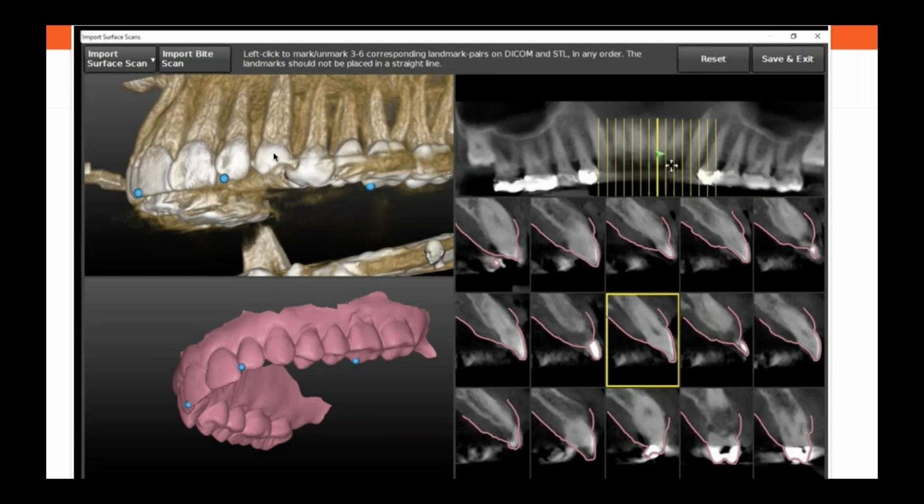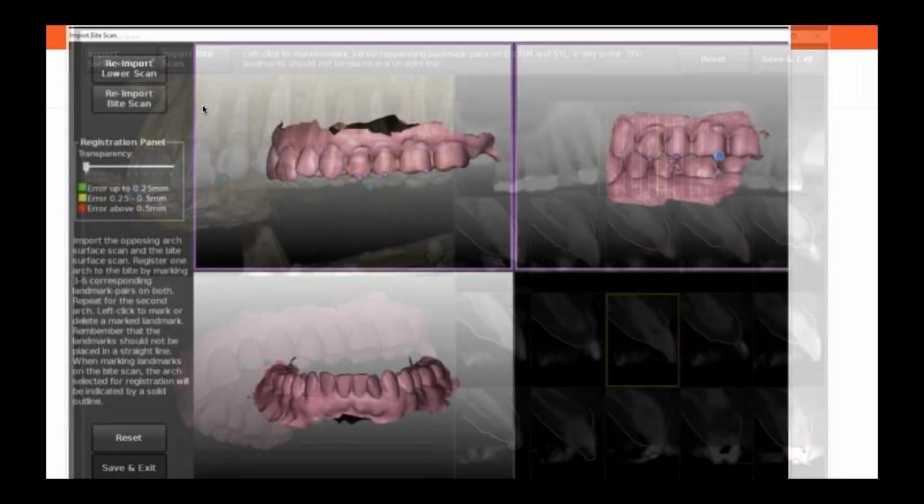As you can see in the bottom right quadrant, we can scan the matching that has been carried out by our 3 points and by the software, and eventually amend it, add other points if necessary, or simply go on by importing further STL files. And this is the button and the key that allows us to do that.